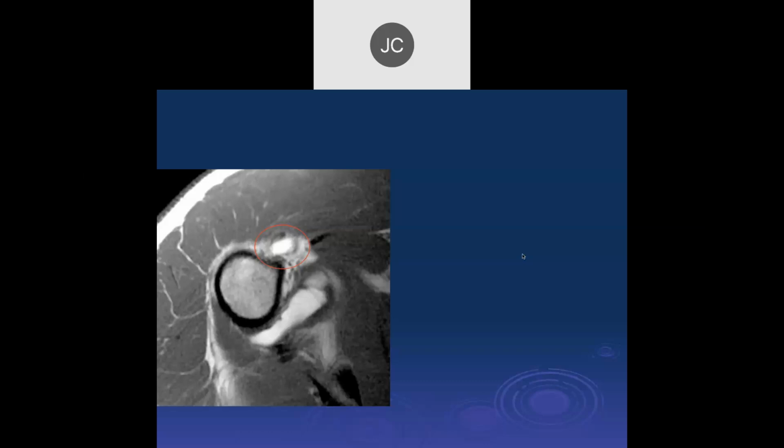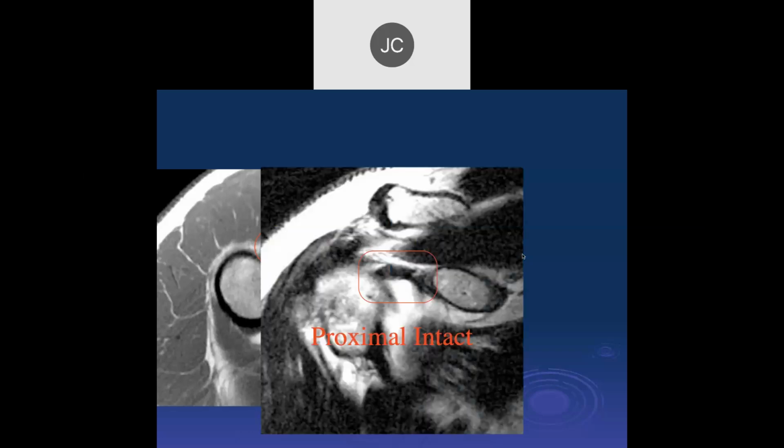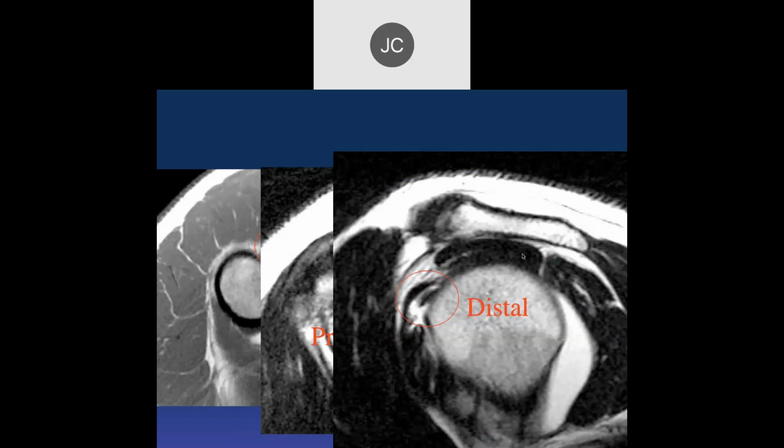All right, so where I expect the biceps to be, I don't see one. I just see fluid in the sheath. So it looks like it's torn. If we go approximately here, that's the biceps anchor. There might be a SLAP tear there, but the rest of it looks okay. So this actually was uncommon. Almost always the biceps tears proximally around the anchor. This one actually tore in the intertuberous groove, so it was more a distal tear than the normal tears.